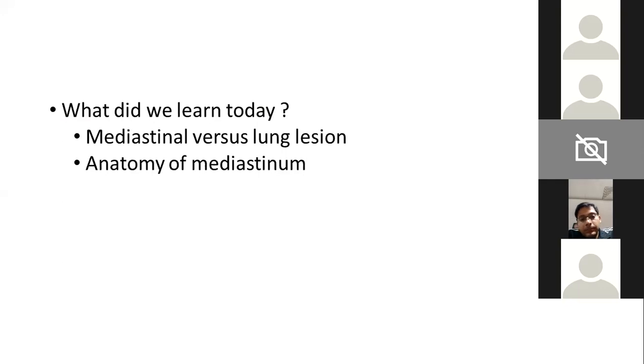We also discussed the vascular anatomy on an axial CT, how to identify different structures, like different types of classification, and we concluded that till now, I think we should just continue with Felson's classification. And some important stripes and lines. All stripes and lines I didn't mention, and it is not required. So we only mentioned what are useful for us, okay?